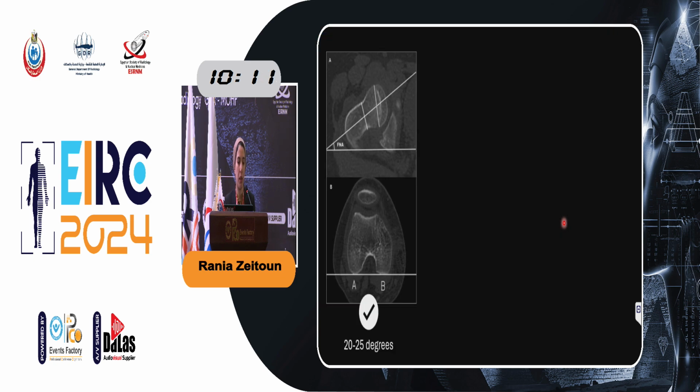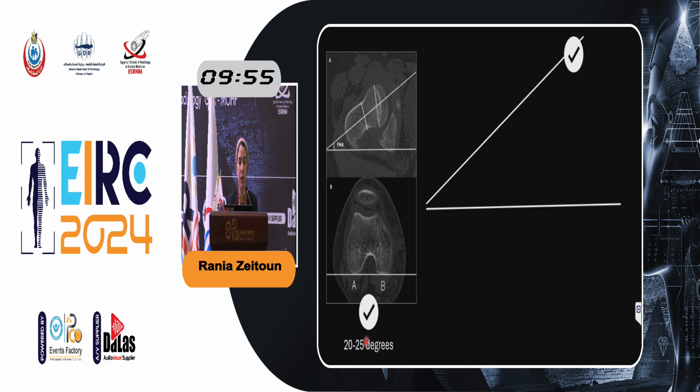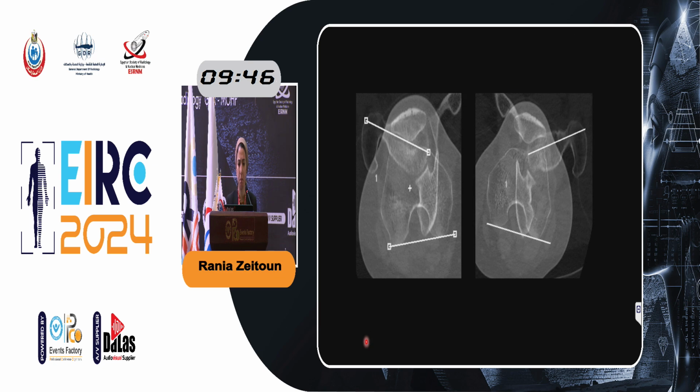And now the rotation abnormalities. Normally the femur neck should be in a state of external rotation compared to the distal femoral transcondylar axis, and the angle in between should be in the range of 20 to 25 degrees. So an excess anteversion, or an increase of this angle, or a reduction of the angle, both are abnormal and both result in pathological pain.